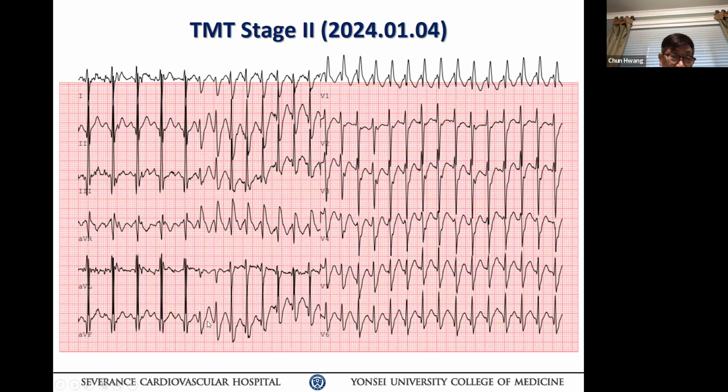The different, right? 네. 그러면 이게 무슨 소리야? This could be a trigger, right? 네. First beat. 그 다음에 gradually morphology가 change하면서 QRS도 바뀌고 특히 리드 2 보세요. 리드 2 보시면 가다가 점점 더 깊어지지, 내려가고 그지? S가 와이드 되면서 R 웨이브는 내로 되기 시작해.